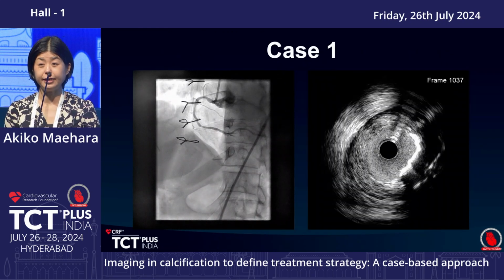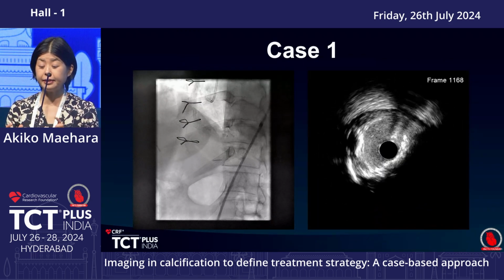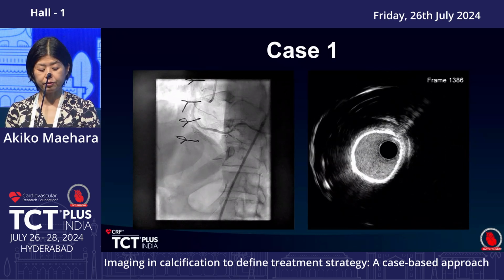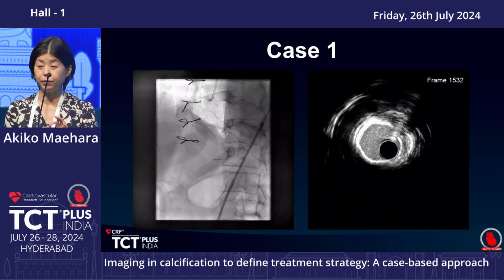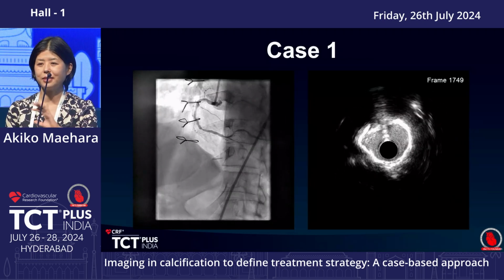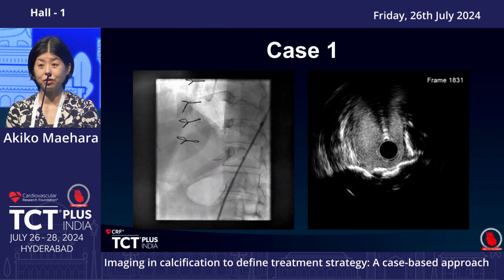The second one is actually really, really bad calcium. So I'm going to show the movie, because the longitudinal information is important. Starting at the distal, number 1, big artery, and you see very circumferential calcium already, and that circumferential calcium continues, still calcium, and still calcium, and this is a place where the rotablator was done, as I showed, and the proximal portion, still calcium, circumferential, up to the end. So almost the entire segment in this case was circumferential calcium.